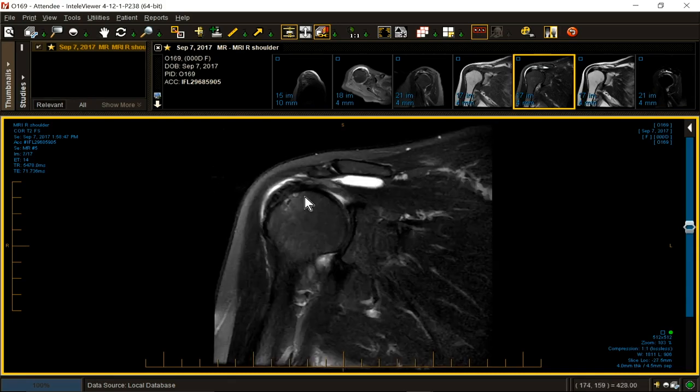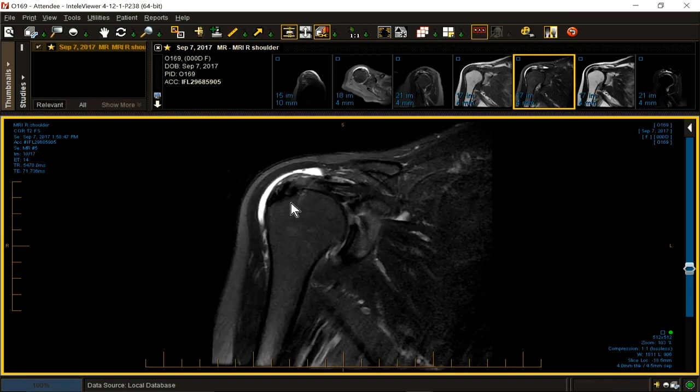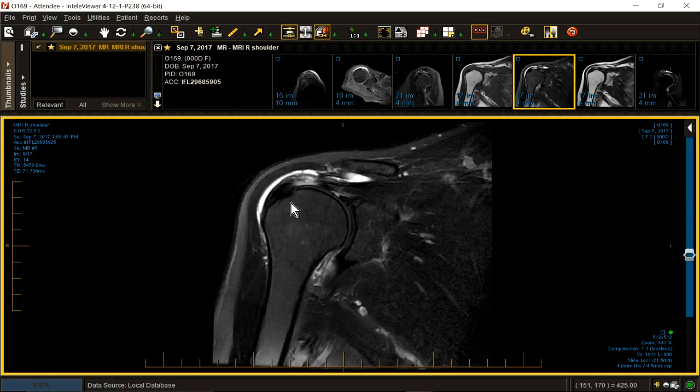We have innumerable posterior-superior, lateral pits and areas of pseudocyst formation consistent with somebody who's experienced friction-type impingement. Common. You used to hear this is a normal phenomenon because everybody has them. No, it's not normal. Might not be symptomatic, but it's not normal.